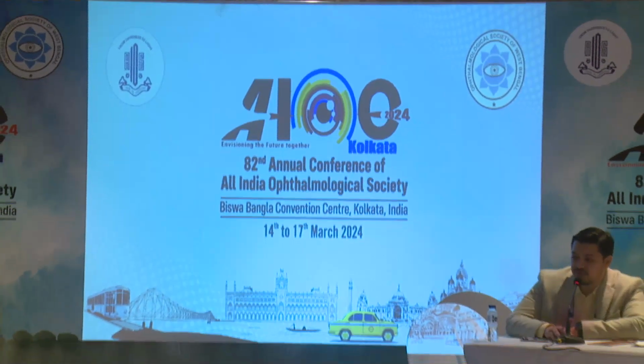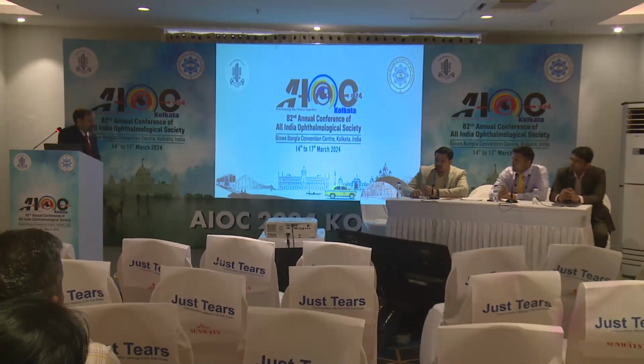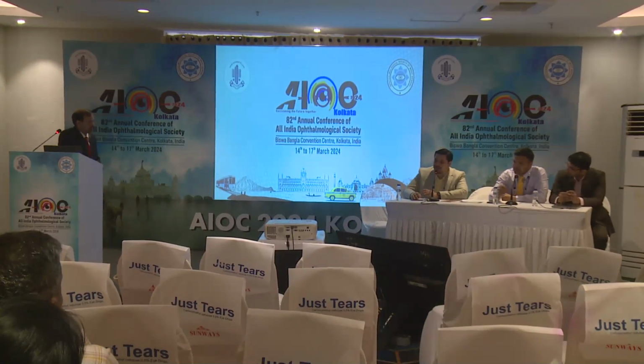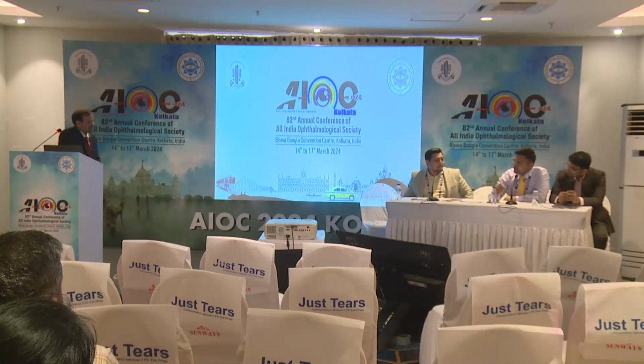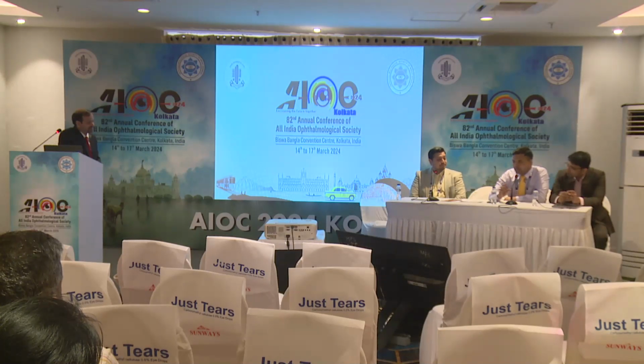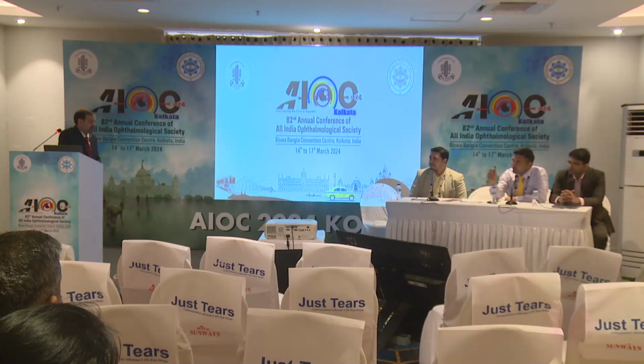Thank you, sirs, for giving us such a comprehensive review of OCTA in diabetic retinopathy. If you allow, sir, one question based on your study. We have all observed that when we do OCT angiography in diabetic retinopathy in the central 3 mm area, you see these beautiful capillary non-perfused areas in the posterior pole. Do you offer any treatment based on this? Do you laser those areas?